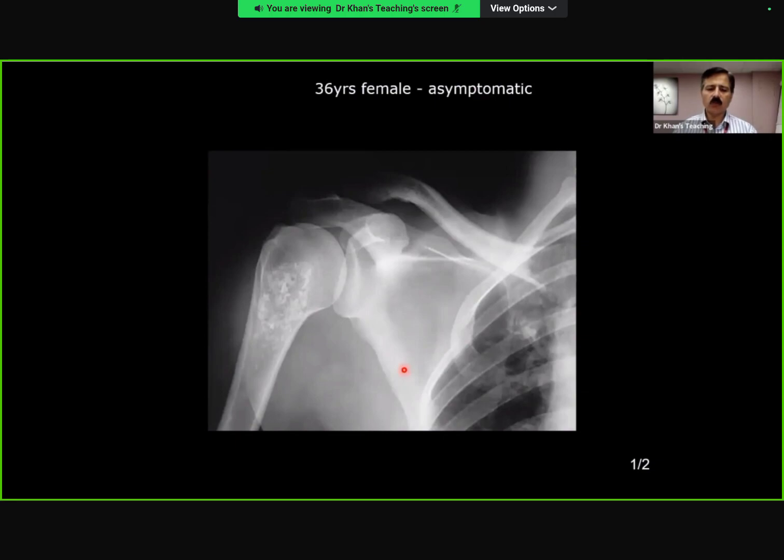Enchondroma in the short bones of the hands, for example, you will see lucencies, right? Here you might not see. The only key is the chondroid matrix, which is classically defined as rings and arcs and nodules, right? And as I told you, if it is serpentinous, then that is a bone infarct. That's different radiology.